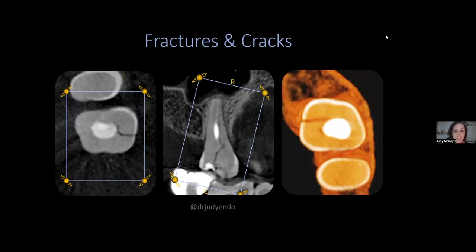In these images that I'm sharing on the screen, you can see that there's significant separation. So the CBCT scan is going to capture that, and that's what's going to be conveyed. However, a lot of fractures and cracked teeth don't show images like this, no matter the CBCT unit you have. It's just the amount of separation.